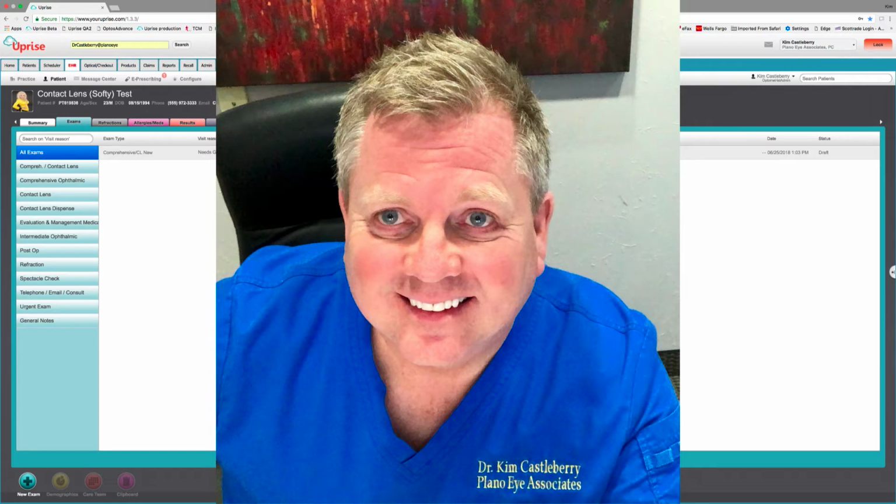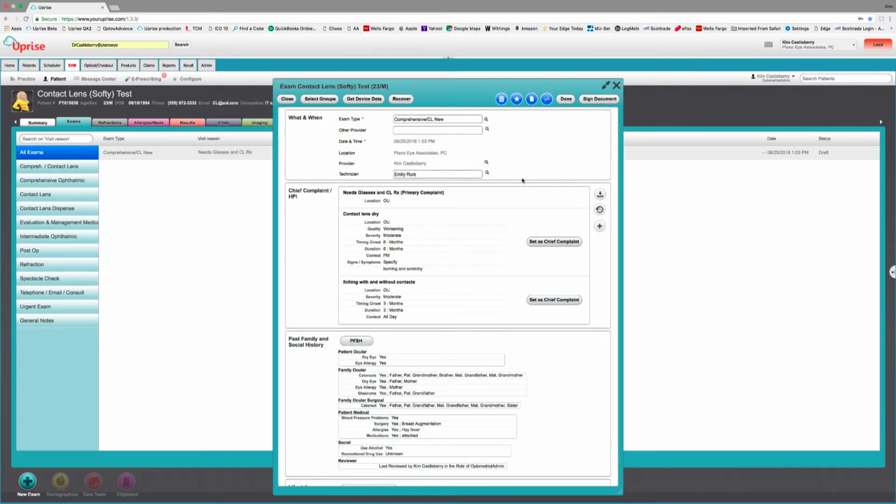Hi, I'm Kim Castleberry, and I helped design the Uprise EHR for high-level contact lens care that represents the workflow of most contact lens care providers. I think the best place to start is up here at What and When with the exam type. You can pick an exam type that respects the workflow of your particular practice.